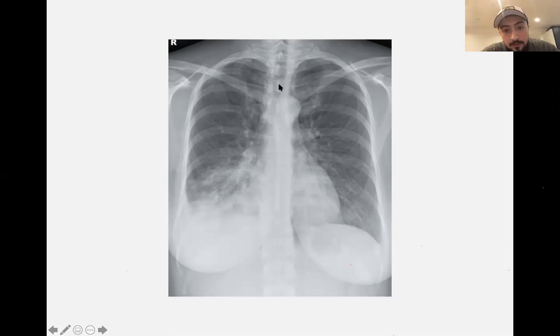Okay. So if we start with A, you can see this one, the trachea is in the middle, the windpipe, so it's not deviated. You can see the left main bronchus, the right main bronchus, and then moving on to B. So B, you can see the lung markings extending all the way to the edge of the lung. Okay, and then you can see some diffuse consolidation in the right lung in the lower zone. Okay, so what does that mean?